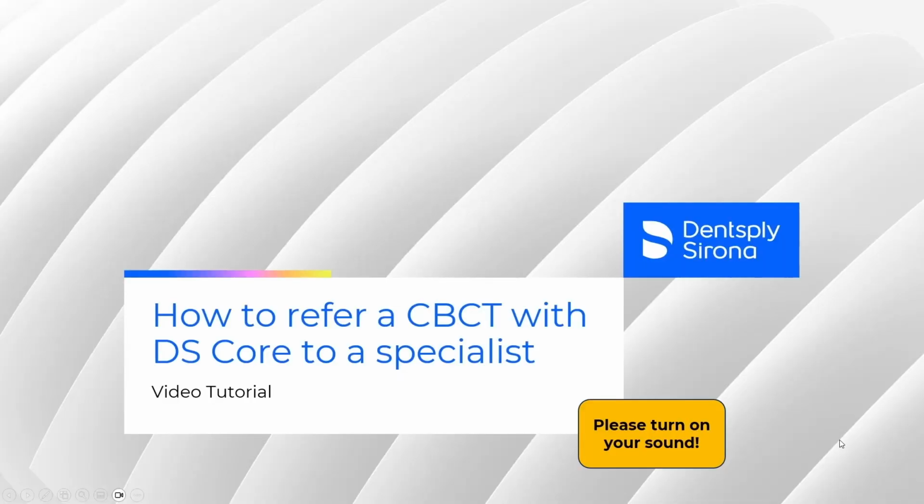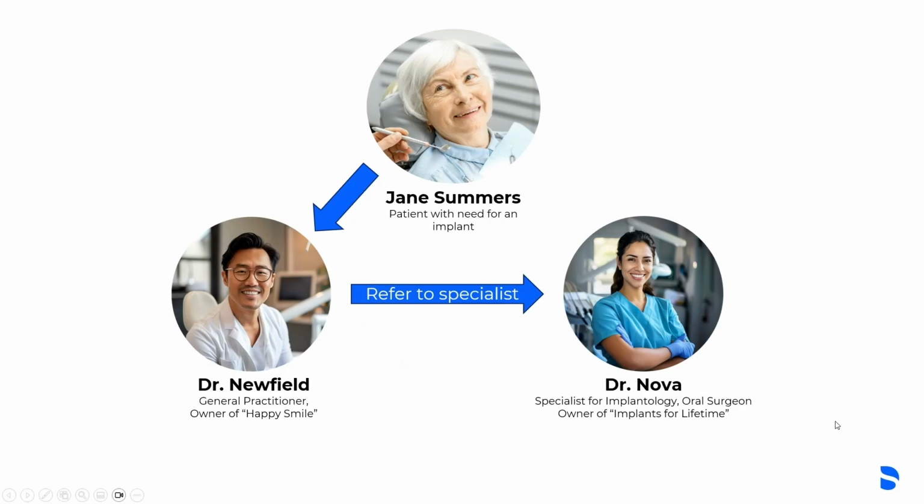Hello. In this video, we will show you how easy it is to share a CBCT that was acquired with Sidexis 4 with a specialist for implant planning by using DS Core. We want to introduce you to the cast of our scenario.